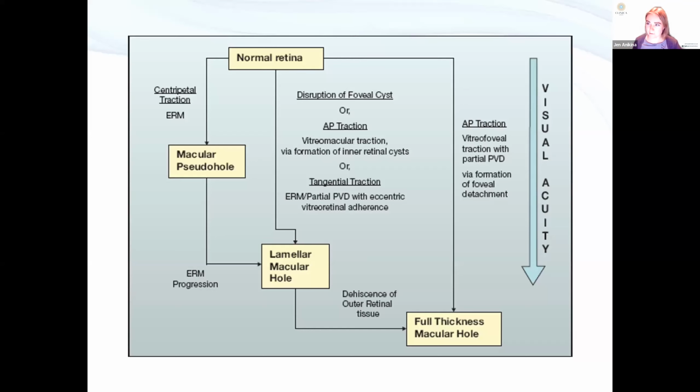Lamellar defect. Thank you. Lamellar defect, not hole. I'm retraining people. Do we review in 3 to 6 months? Yeah. What factors dictate? That's a very good question. That's an excellent question. And do you know why I really like that question? Because you're happy to monitor them and refer them when it's appropriate. I really like that approach.